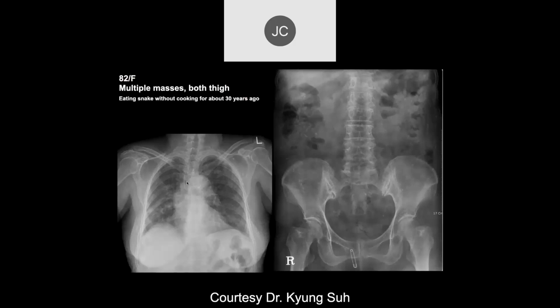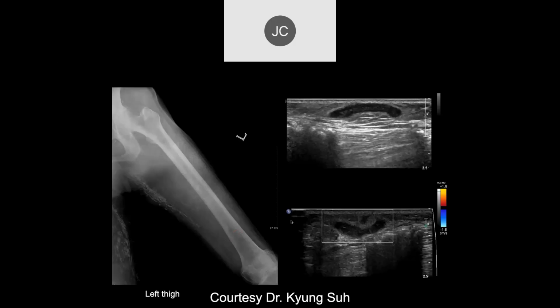Okay, so we have some patchy stuff in the lungs there. Abdomen, a couple of calcified lymph nodes, maybe. So some sort of granulomatous thing going on, or is this? Well, these are all calcified. Yeah. Well, there's a calcification. See some over here too. We have some right and left thigh calcification too.